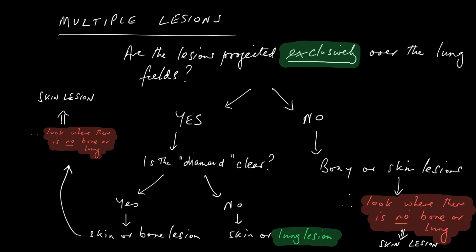Don't forget that this particular logic doesn't apply very well to solitary lesions, because solitary lesions, when projected over the lung fields, assuming they are not overlying the diamond, could be in bone, skin or lung. And so it's much more difficult to apply that principle.